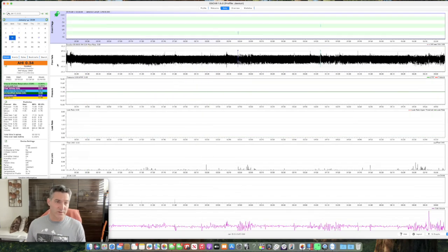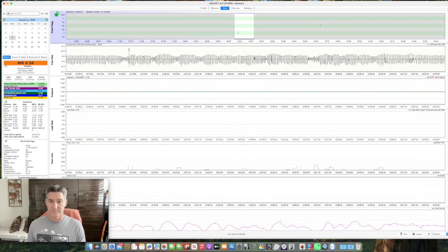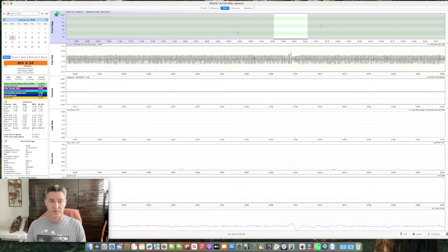So I can go back to the 13th if I want. How did I do there? I use the same pressure. Do we see some problems in here? I mean, no, for the most part, it looks pretty friggin' good.